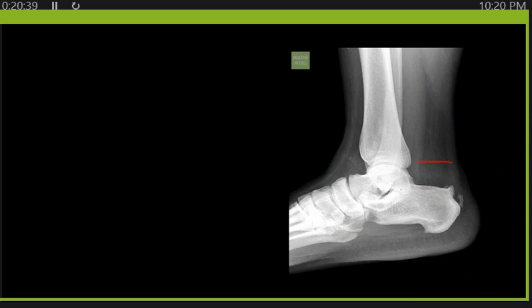Okay. Any question on this? Okay, we can move to the... Doctor, in this picture, is it calcification in the tendon? In the tendon, yes. It is calcification in the tendon, okay?